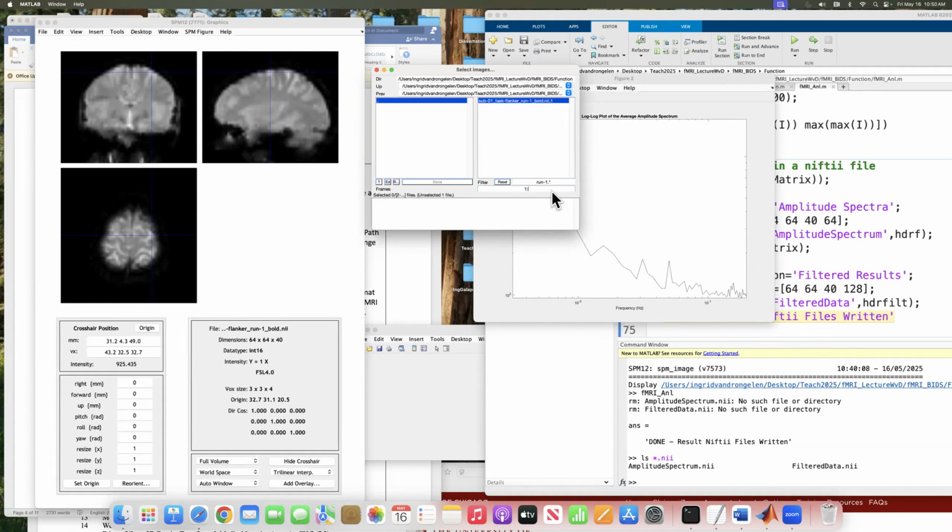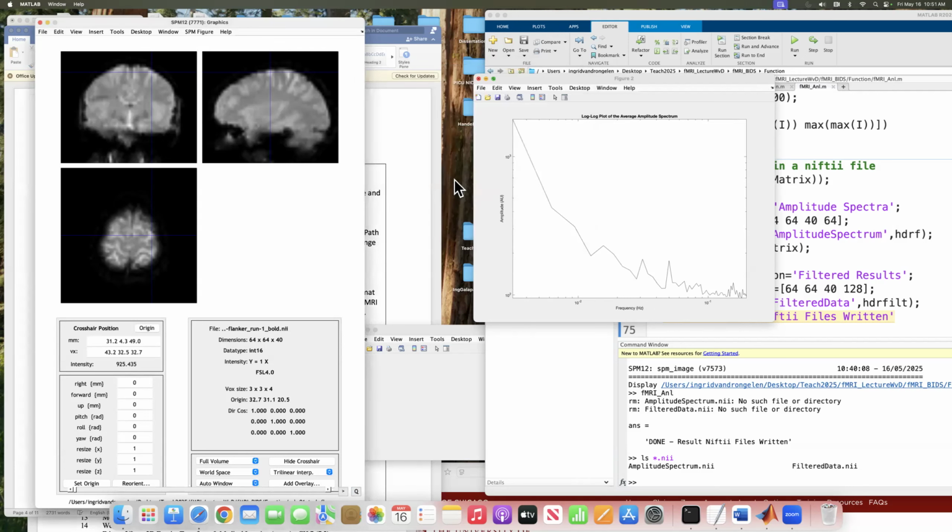So I'm going to look at images from time steps 1 to 250. And now I hit enter. And now you can see that it shows you in the dialog where all these different time steps are. And now you right click and you say select all. And then you hit done.